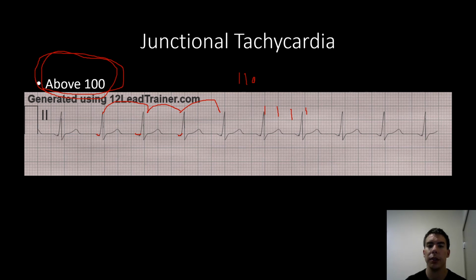So then our intervals, if there is a P wave in that Q-ish looking wave, going on the second to last one, from there to there, so that's like maybe 0.04, maybe 0.08 seconds. So short, PR is short. And then our QRS is about 0.08, I guess. Yeah. So our QRS is normal, PR is short.